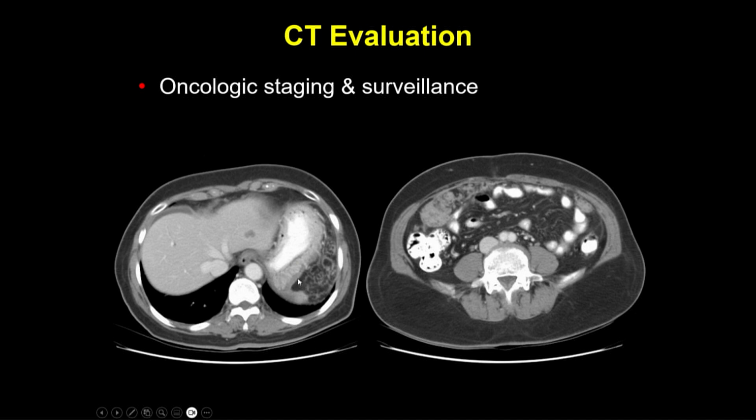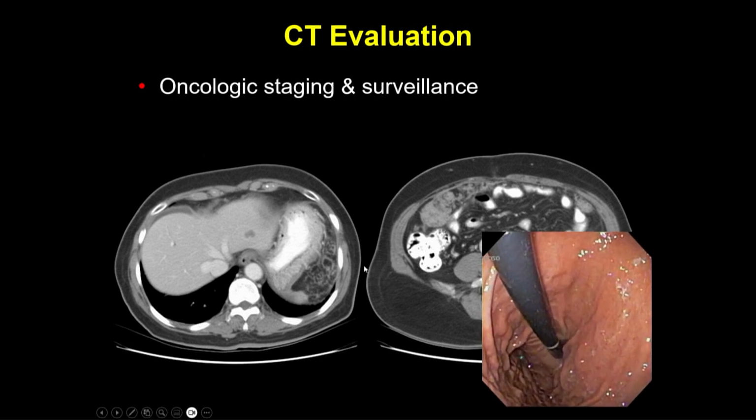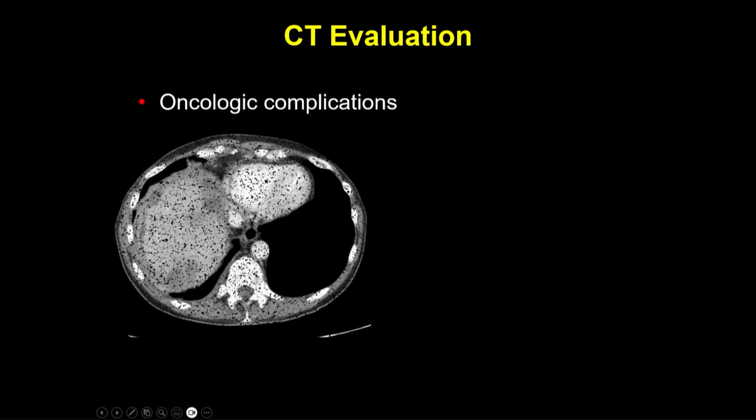So, that signet ring type morphology with infiltration of the stomach, but also peritoneal disease, omental caking. This patient actually had a negative endoscopy, right? We saw the thickening, but it's deep to the mucosal surface. So they'll sometimes look totally normal if it's not significantly narrowing the lumen. They may just call this normal, which they did, but CT can put that all together nicely.